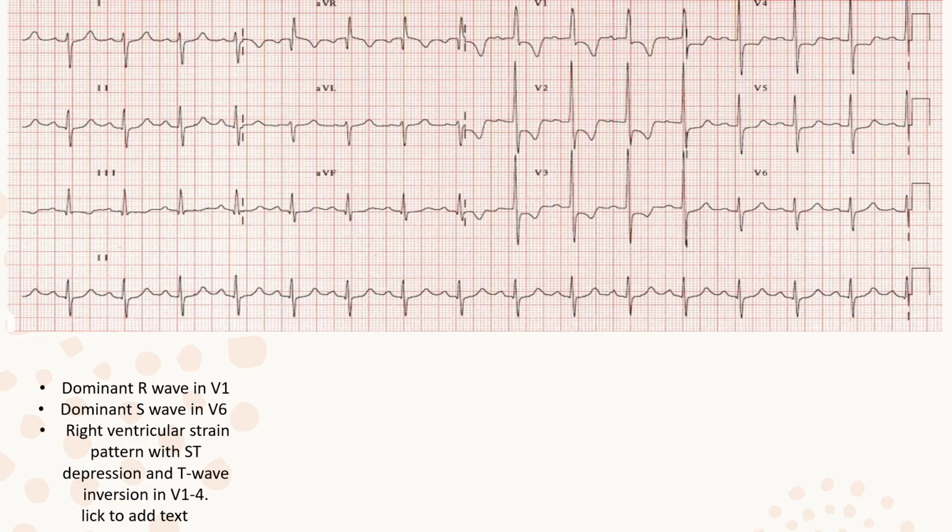And so here we can see, let's start by looking for the atrial abnormality. Do we have that? That's a pretty big P. It's not huge. I'm not saying a huge P wave here or anywhere else, but I can see this really tall R wave in V1. Remember, V1 traditionally is negative.